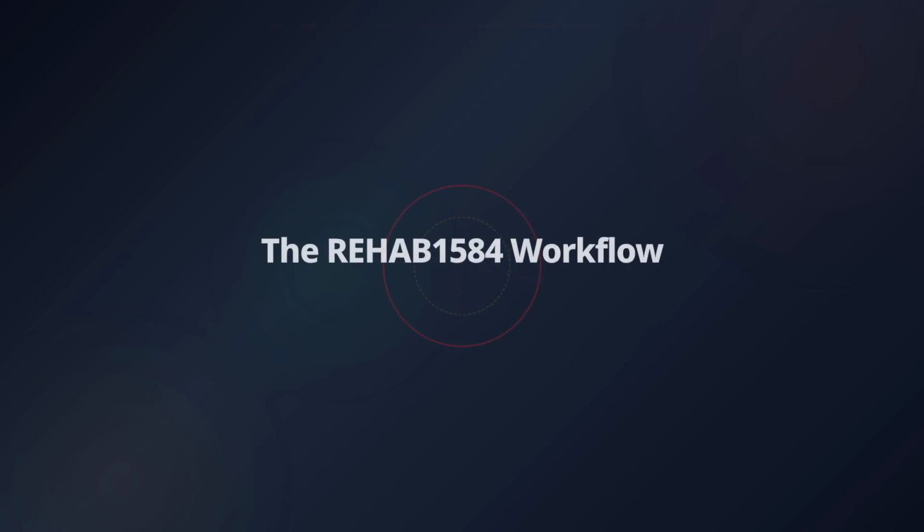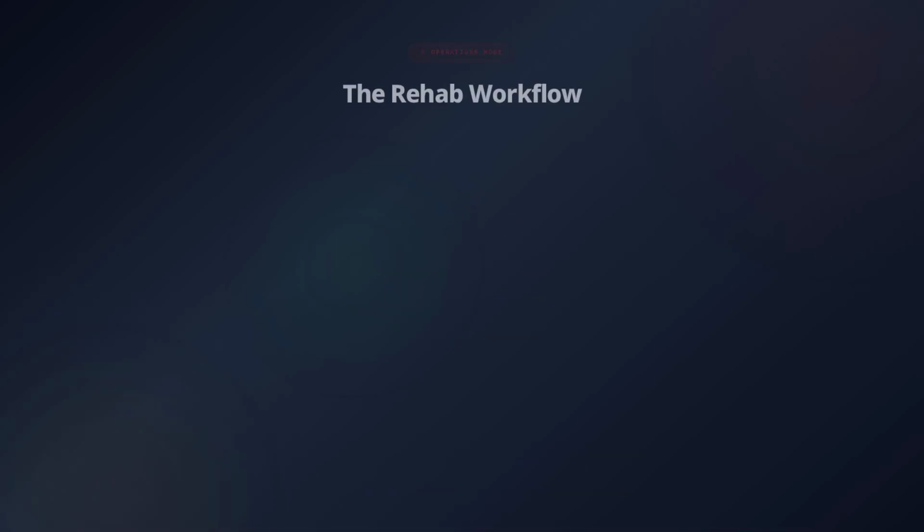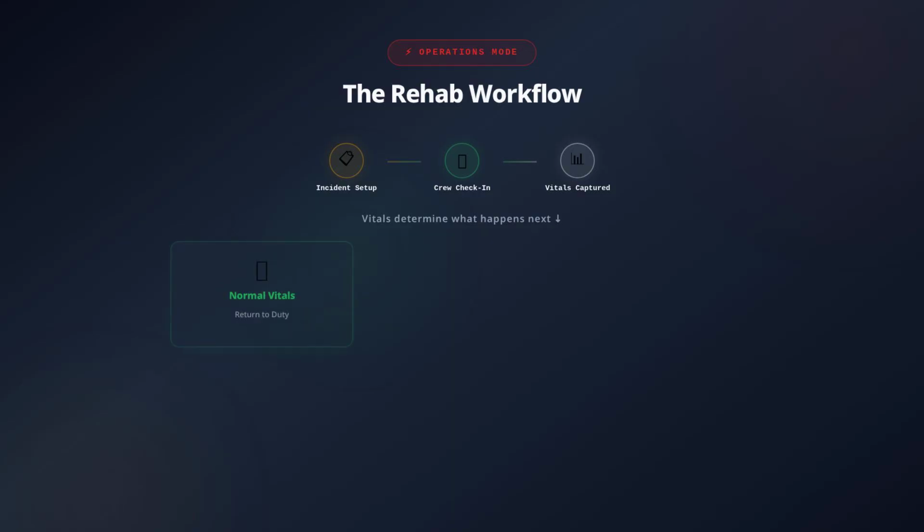Every emergency runs on a sequence. Rehab 1584 follows that sequence from incident setup to final documentation, with every step captured in a defensible record. In operations mode, the workflow starts with incident setup and crew check-in. Once vitals are captured, the system determines what happens next.